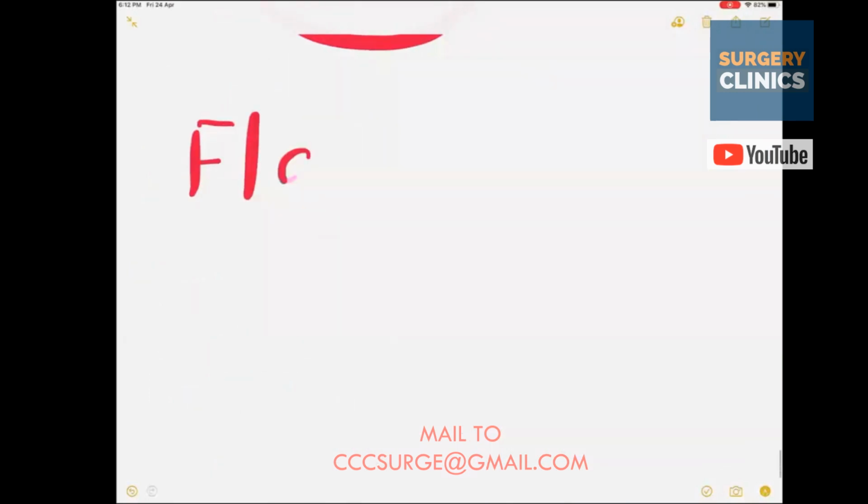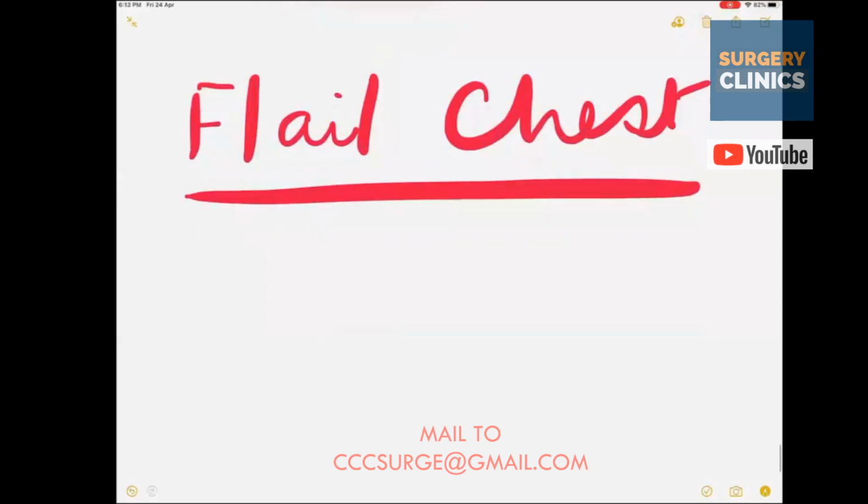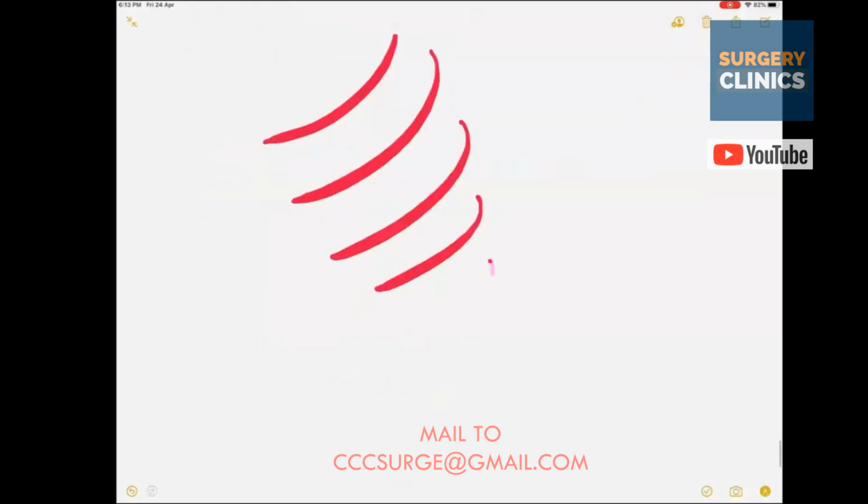The word flail chest means that by definition, there are rib number 1, rib number 2, rib number 3, rib number 4, rib number 5, rib number 6.